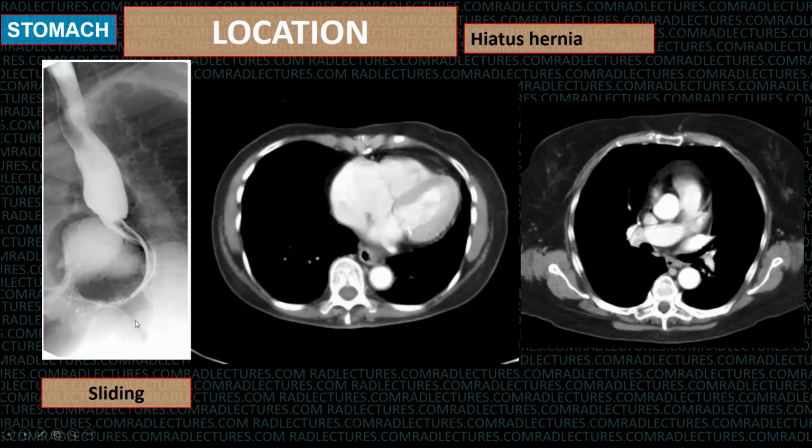Whereas if a hernia is seen in the prone position also, and when you make the patient stand up you can see the hernia still there, then there is a possibility that the esophagus may be shortened. You must draw the attention of the surgeon to that, because if the esophagus is short and you try to reduce the hernia, that operation is going to be unsuccessful. Therefore, the surgeons have to operate on the esophagus and make it longer by doing certain procedures so that it does not pull the stomach back up after surgery.